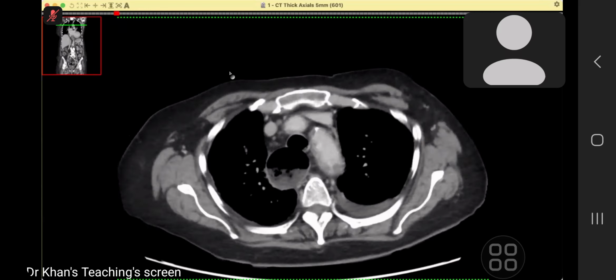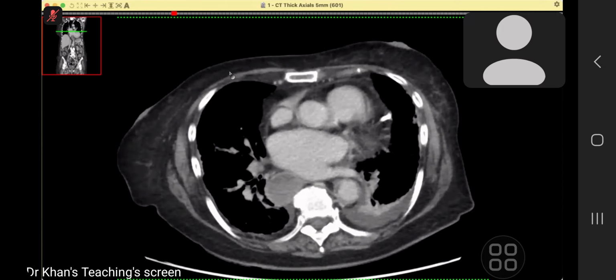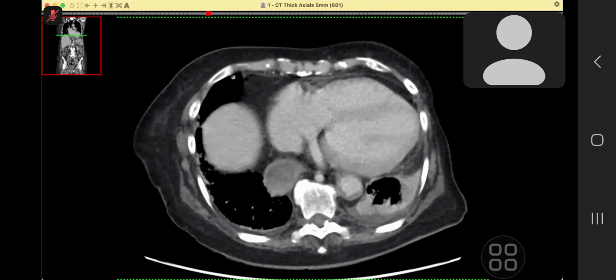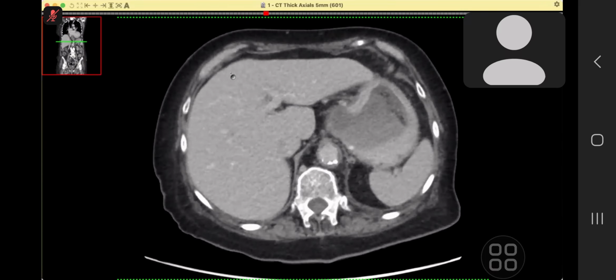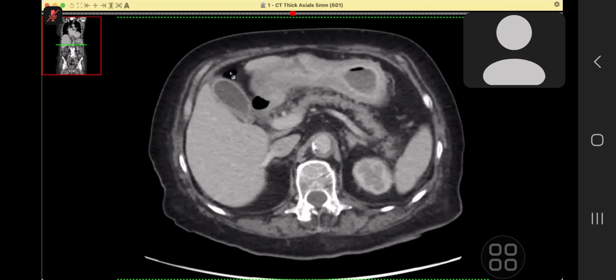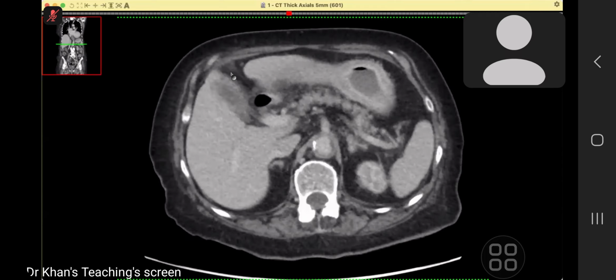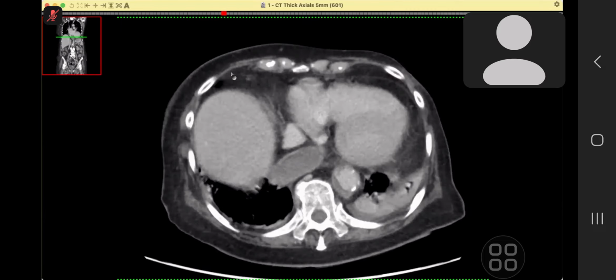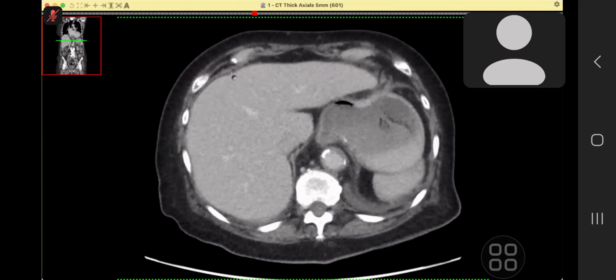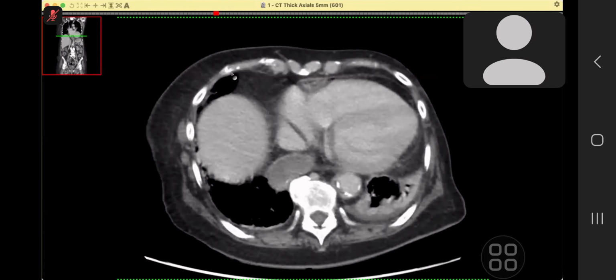This shows a massively dilated esophagus with air debris leveling at the upper and mid part of the thoracic esophagus. The esophagus is dilated down into the stomach, but the stomach shows an almost symmetrical mural thickening and luminal narrowing. So I'm suspecting linitis plastica of the stomach.